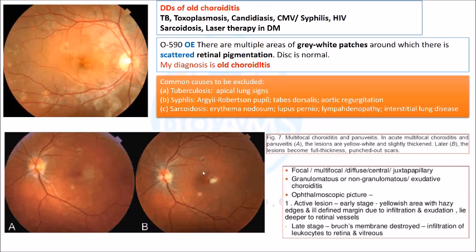Many where there may be choroiditis or chorioretinitis. And this appearance, like these are almost white, not very diffuse. Okay, so why is there a diffuse appearance initially? Because there is inflammation, there is fluid, there is exudation. So this appearance is edematous. So this is acute. And as it becomes almost dry, with less edema, there are scars. So this is old choroiditis.